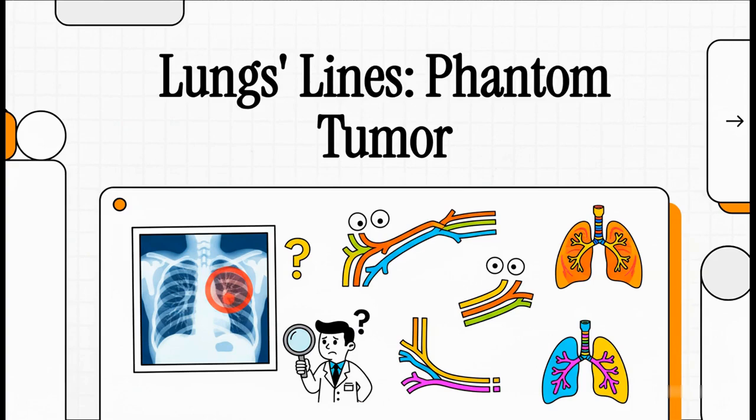Today, we've got a really cool medical mystery for you. It's one that starts with something pretty routine, a chest X-ray. But what was found on it, well, it's the kind of thing that would make any doctor's heart just stop for a second. Let's get right into it.